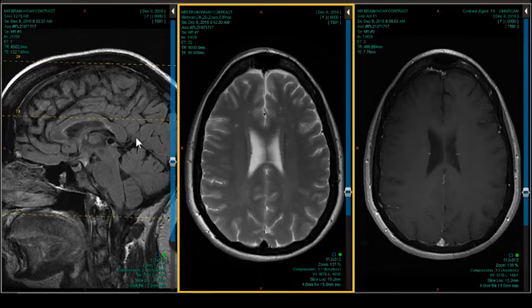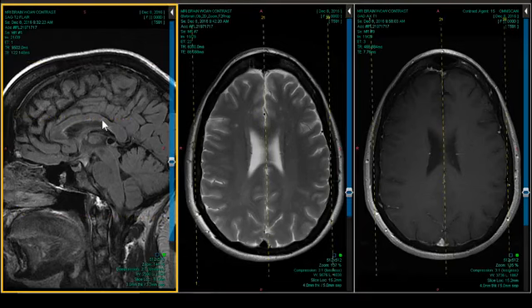They have subcortical disease. They might have infarcts. They might have atrophy. Their brain iron is distorted. They have a history of hypertension. And for MS, they don't have this predilection for the temporal-occipital distribution. The lesions are not right angle oriented or perivenular.